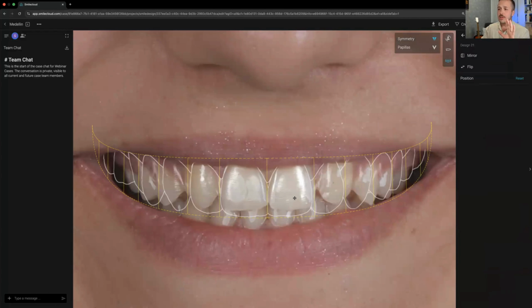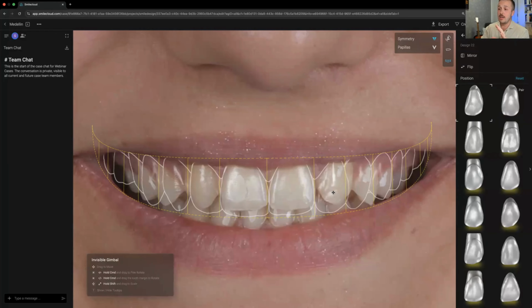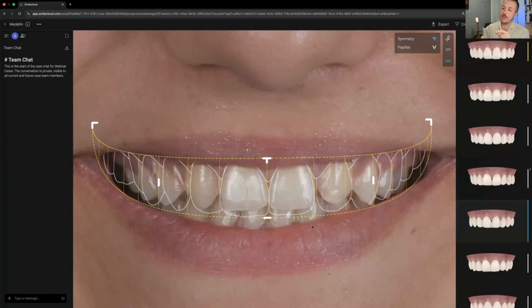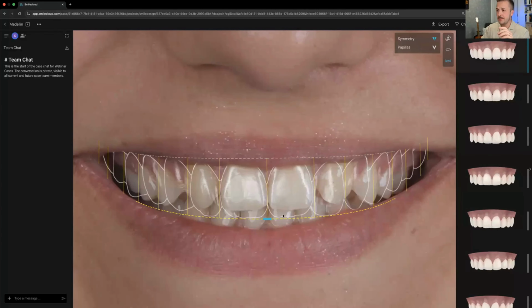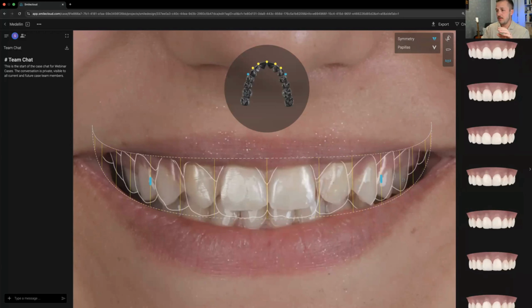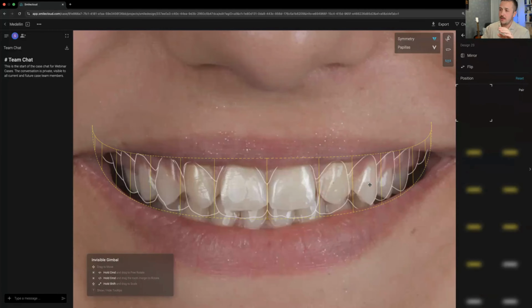So now I want to keep a certain level and positioning of the teeth. I want to keep certain incisors in this design. So I'm actually going to try and move the teeth manually. I don't want to spread out this grid anymore. So I'm going to see if it's possible. Maybe not. So I have to widen it a bit more. Okay, now this is more plausible. Okay. Move it a bit more to the side.